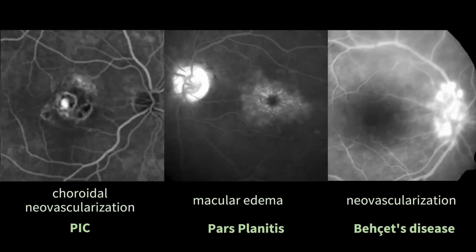The second picture shows macular edema, showing the typical petaloid pattern, and that's how macular edema presents in things like diabetic macular edema and CRVO, but it can also present in a very similar way in patients with uveitis. And lastly, neovascularization can also be present in patients with uveitis. So the patterns that you typically know, CNV, macular edema, neovascularization, can also appear in ocular inflammation.